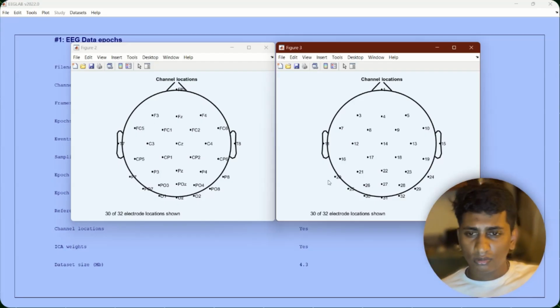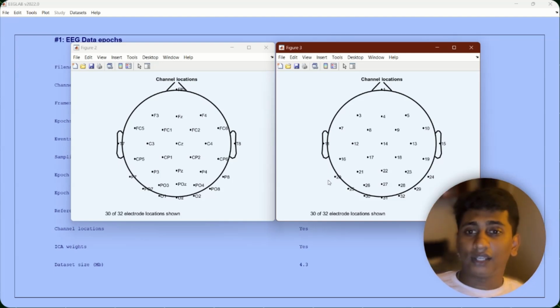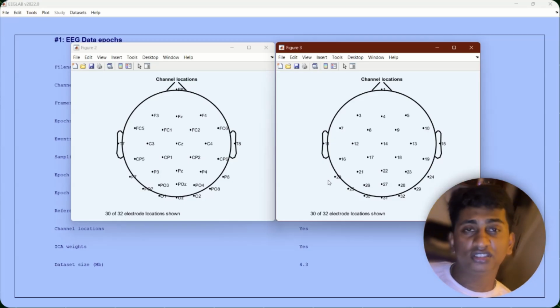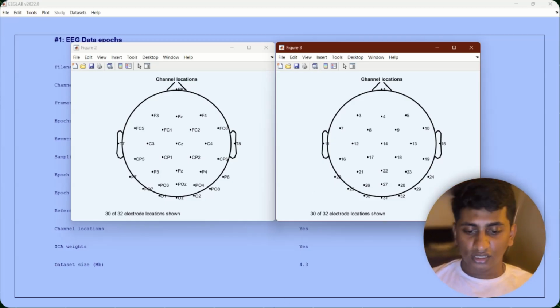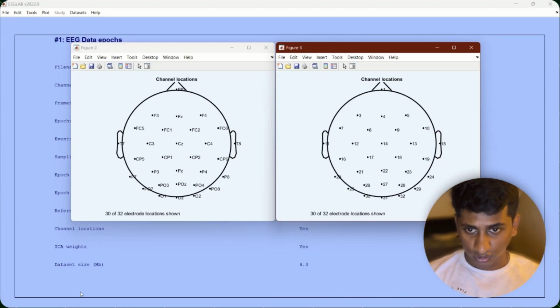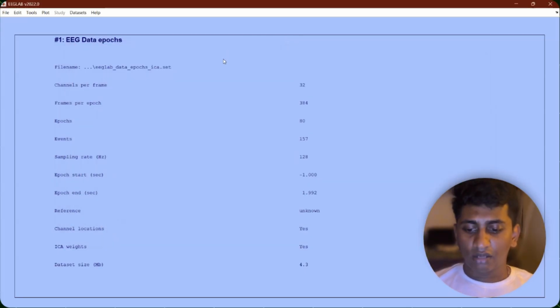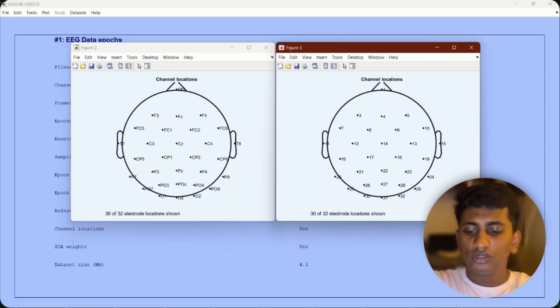I don't know whether you can see my mouse. Yes, there are electrodes here, here, here. I'll be showing the other outputs, and when we go into more depth in the analysis you'll get an idea. The same interpolation grids are used in the CNN, and consistent spatial patterns are used. This confirms the channels like C3, CZ, C4 are placed correctly. These are the motor channels. So these are the parameters you need to note. I'll just keep it open for some time.